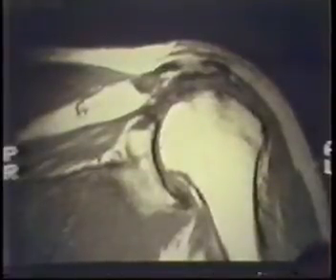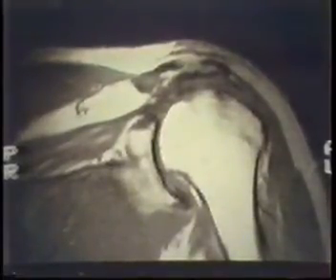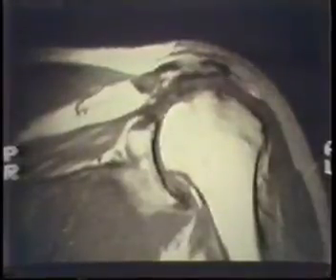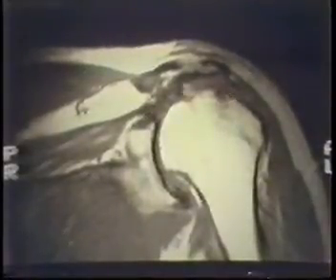No skip, did you say? No skip. In that case, then, are you inferring a tear because of the abnormal position of the tendon? Yeah. Or you're not actually seeing the tear itself? Oh, this tear is so big. We are actually. This is the proximal end of the tendon there. The distal end of the tendon actually is right there. That's all tear from there to there.